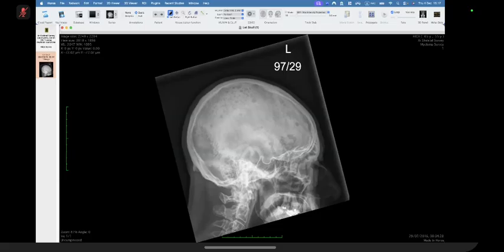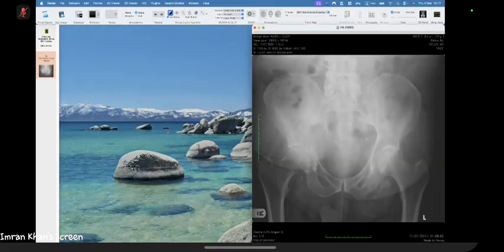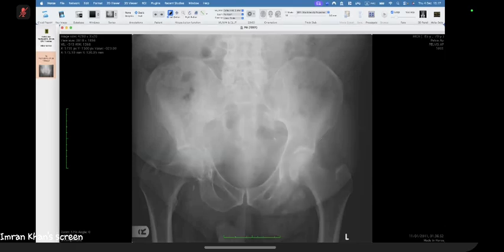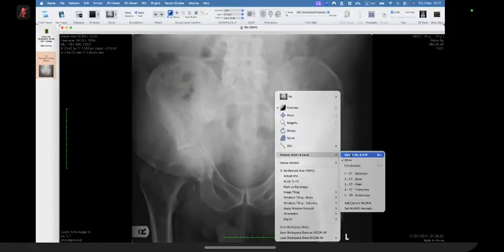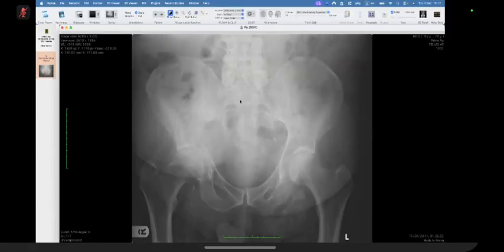Okay, let's look at this one. Patient with left hip pain. X-ray pelvis, frontal projection, of a skeletally mature patient, where I can see a displaced and avulsed left ischial tuberosity, which is giving irregular sclerotic margins.